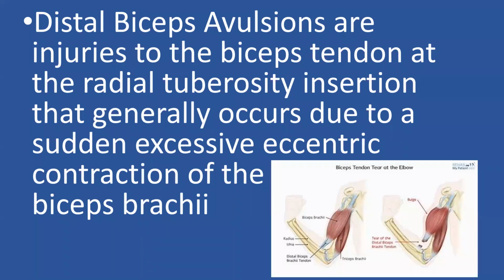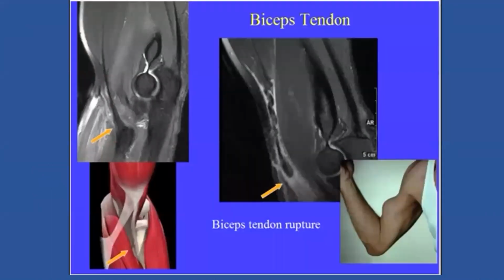Okay, fine. Biceps tendon, we all know about it. There's the long and the short head. The short head is ruptured from its insertion on the radial tuberosity. This occurs whenever a force opposes flexion of the elbow. It can be detected on MRI and clinically. Clinically, the patient will have a bump on the anterior aspect of the forearm, and this is what we call a Popeye elbow. It appears as such on the photograph, and you can see the avulsion over here.